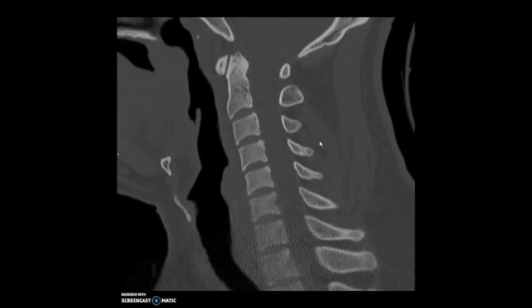But what I found for myself anyways is one way to improve your reading speed and efficiency is to learn the pattern of what the cervical spine looks like, and to learn to know which vertebral body you're looking at just by glancing at the image. And the way I specifically do that is I just always know that C5 is about this distance down from C2. So when I just look at a cervical spine, I know where C5 is immediately.